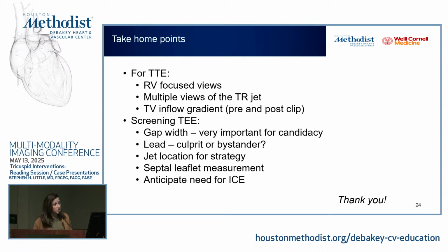On the screening TE, most important is to measure an appropriate coaptation gap, because that's going to be the decision point, one of the most important decision points in terms of sending this patient for a clip or not. With a caveat that some patients have a very dynamic valve, so we can send these patients for diuresis, even IV diuresis before the procedure, and we can try to decrease these gaps.